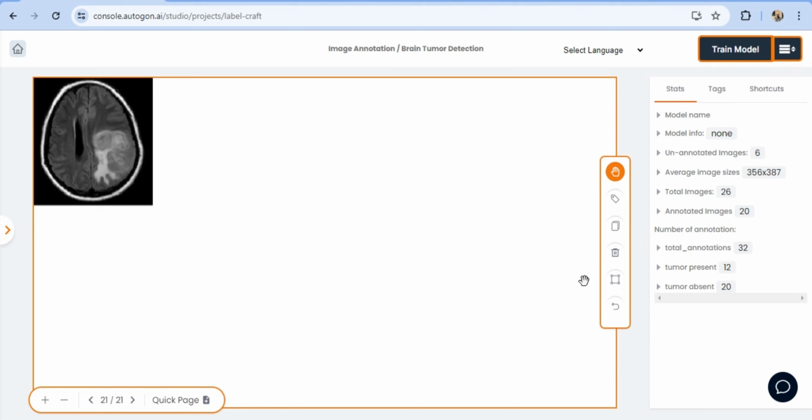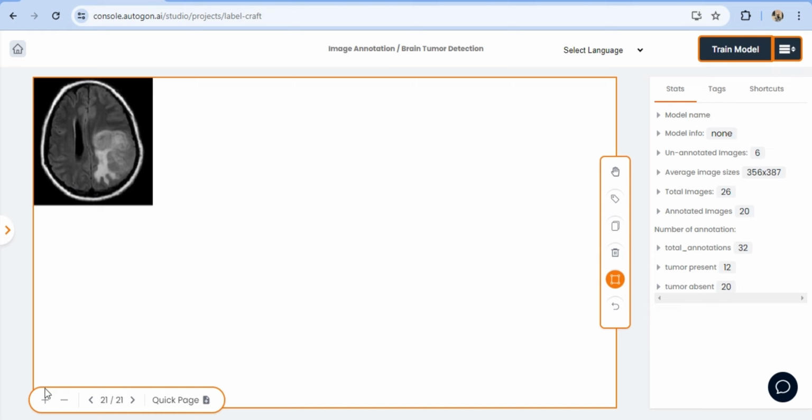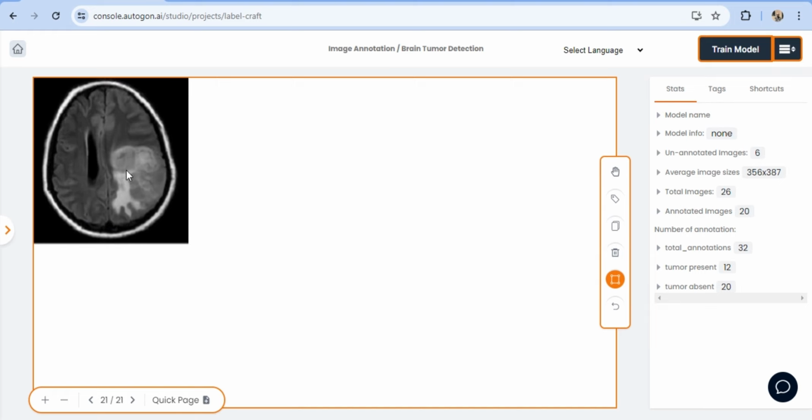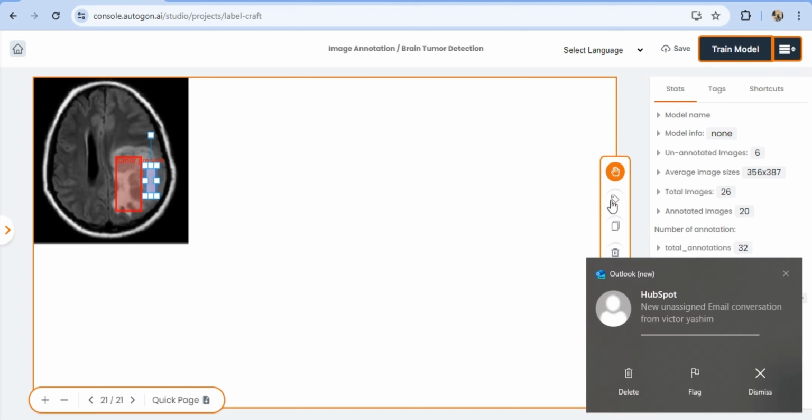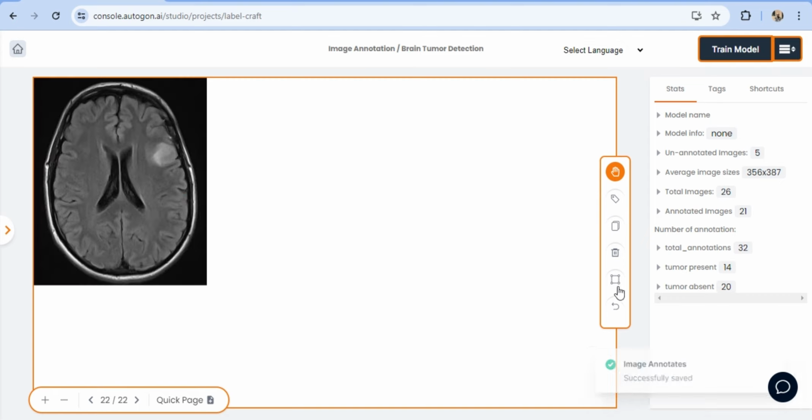You have more images to work with, and with these applications you can already do things around agriculture. We can do this around detecting diseases in plants, and you want to be even more descriptive about the name. Look at the naming convention of what I did here: I just did two things, tumor present, tumor absent. This might not necessarily be the convention that works for you, because tumors can be a lot. They can be different kinds of tumors, even in the brain and across the body. So you want to be more specific if you are a medical personnel, and then you want to have those tumors with their names.